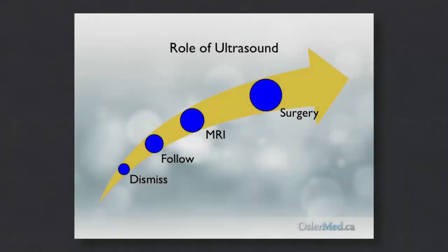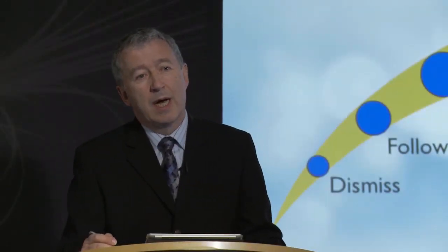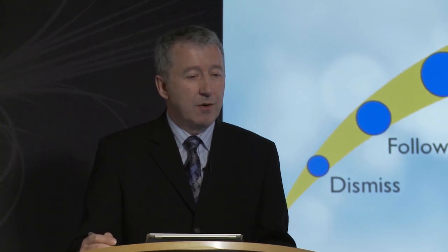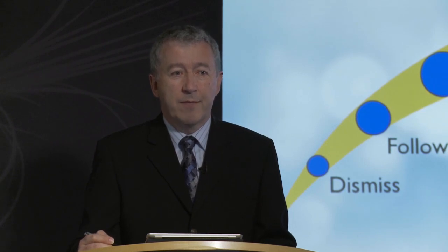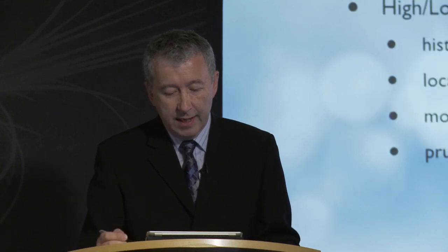Following the ultrasound examination, it should be possible in most cases to issue recommendations such as to dismiss or follow a benign mass, or if there is a high risk of malignancy, perhaps surgery can be considered directly from the ultrasound examination. For the more indeterminate masses, MRI may be recommended because it may be more specific at characterizing these masses, and it's preferable to CT because it does not involve ionizing radiation.